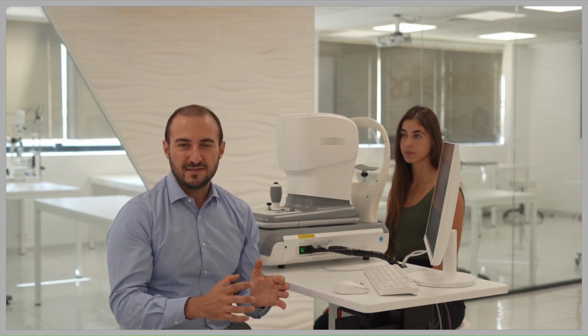Hello, welcome. Here to present you the first official user's guide of our new SLO ultra-wide OCT. In this user guide, I will show you step by step how to operate the device, how to use the software, and all the official features and characteristics of the device.